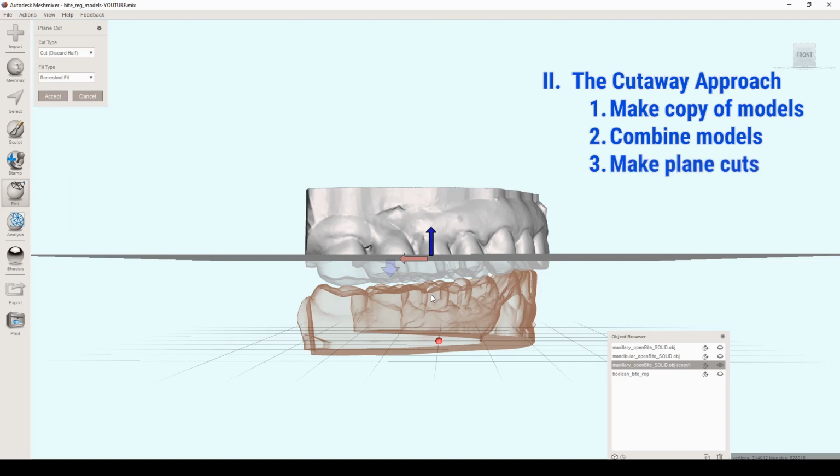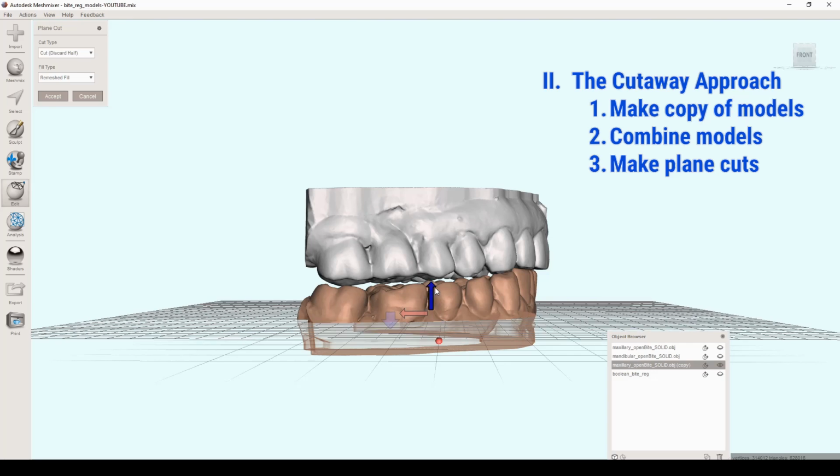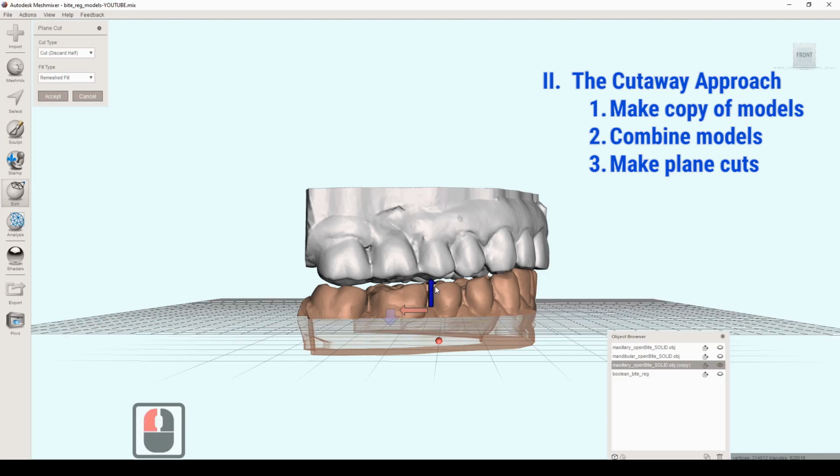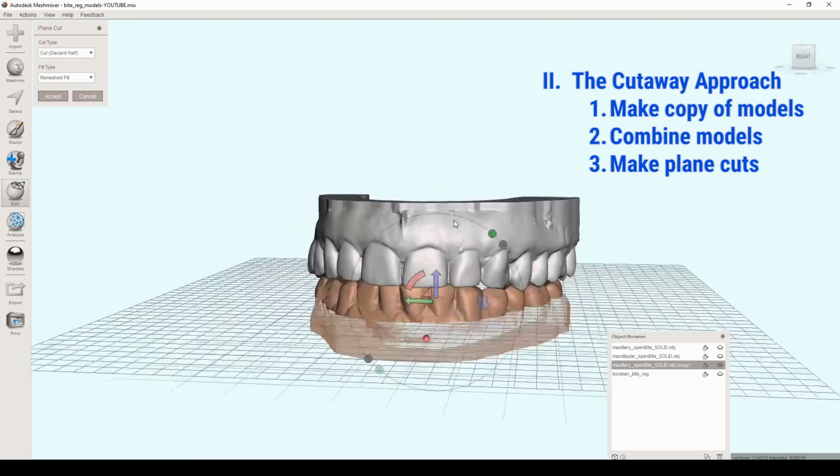I'm going to bring this down this way, actually, and do the mandibular first. I can be a little bit more liberal here this time around. I can just kind of include maybe half of the teeth. It doesn't matter, height of contour, really. You can do all the teeth, but just a good chunk of it. You really just want the teeth.